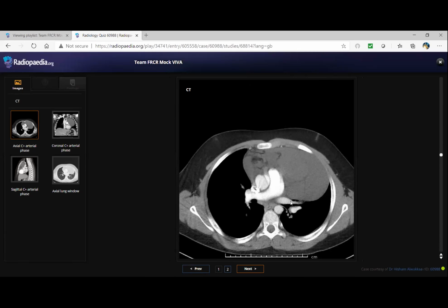Okay. But this patient had undergone several trials of drainage, and it recurs again. I'm just trying to give you a clue. I didn't get you. The drainage of what? He did several trials of drainage of this fluid-like structure, but it comes back. Yeah, it can be lymphangioma, a lymphatic malformation of the anterior mediastinum.